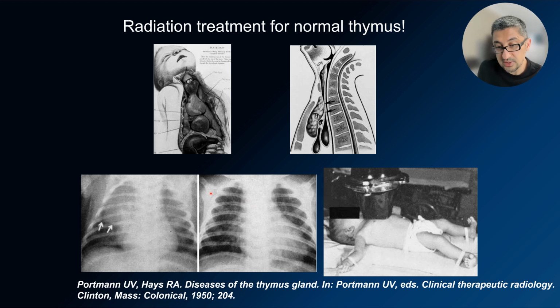After the radiation treatment, the thymus is obviously involuted, and they believed that they had treated the child, and most likely the patient's symptoms usually resolved by then. We are not doing this anymore. Sometimes we just do CTs.